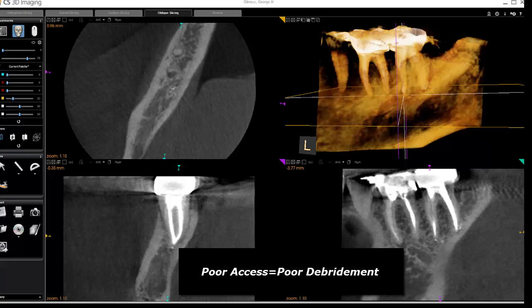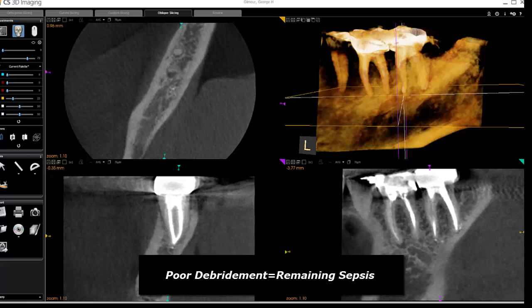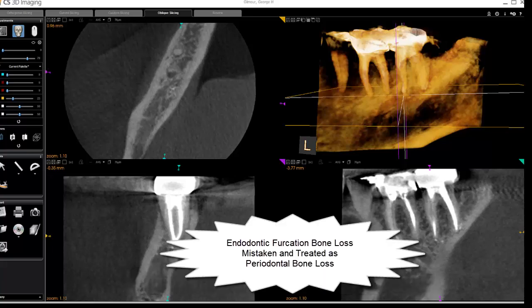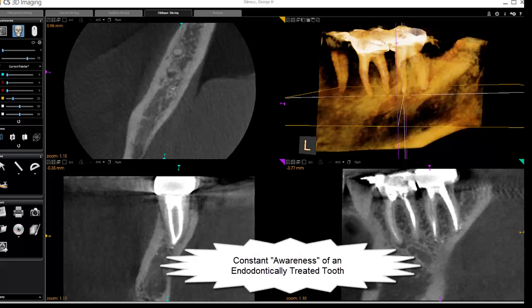I'm going to go through the CT scans and discuss why I believe the current popularity of minimally invasive endodontics and the so-called ninja access have particular problems that really aren't obvious until you look at recalled cases in 3D, and you understand the subtle nuances of perioendo disease and really the subtle symptoms a patient may have the rest of their life related to low-grade subclinical pathosis.